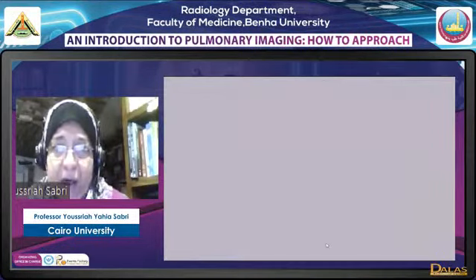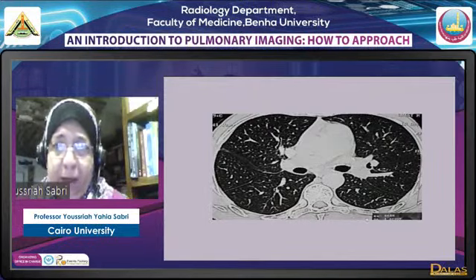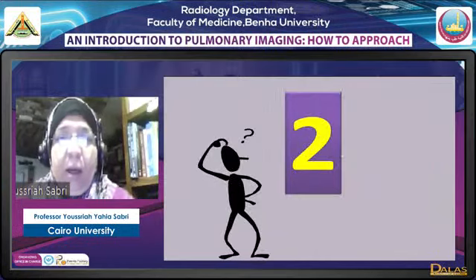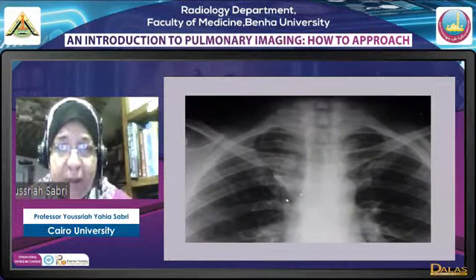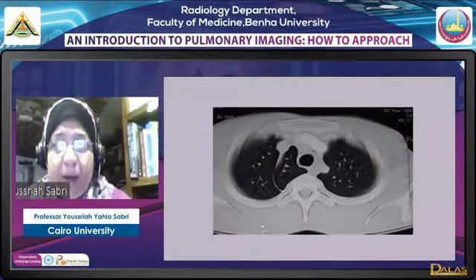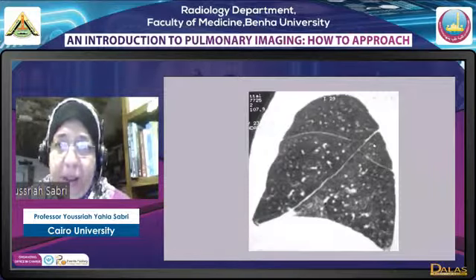في طريقة تانية لعمل الهاي ريزوليوشن ان انا باخد اكزيال ثين كات ايمجز، دي برضو اهو الفيشر بان، فده هاي ريزوليوشن، بس المشكلة انه بيبقى الصورة ليتل بيت نويزي وبتبقى فيه some diagnostic problem especially في النودولز. بعد كده الفاريانت، ذا كومنست فاريانت اللي احنا بنلتقي بيه هو الازايجوس لوب فيشر زي ما حضراتكم بتشوفوه ده منظره في البلين فيلم وده منظره في السي تي. other uncommon variants ممكن بتتشاف في الريكونستراكتد ايمجز بالذات، ده السوبيريور اكسسوري فيشر كاكزامبل اللي هو بيفصل الميديا السوبيريور او الابيكال سيجمنت اوف لور من البيزل.